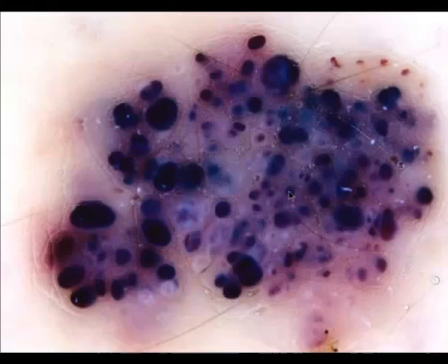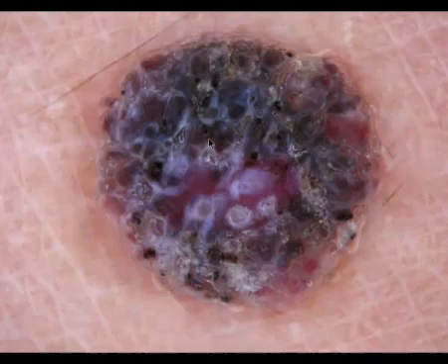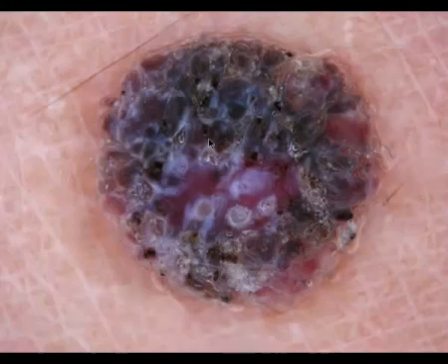Here we have clods, and the color is red or purple or even black, but the color of hemoglobin is predominating and not melanin, so it's a hemangioma. Here this looks very similar, but this is a difficult lesion. You also have blue clods, purple clods, black clods, but also some white clods. And what's the diagnosis? This is nodular melanoma that you should not miss, that is simulating a hemangioma.